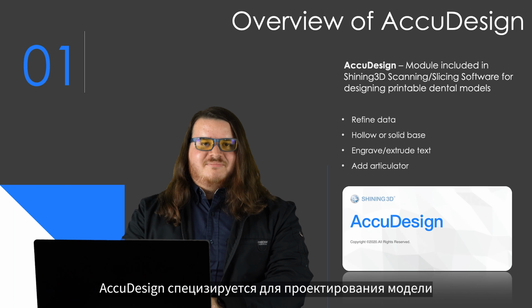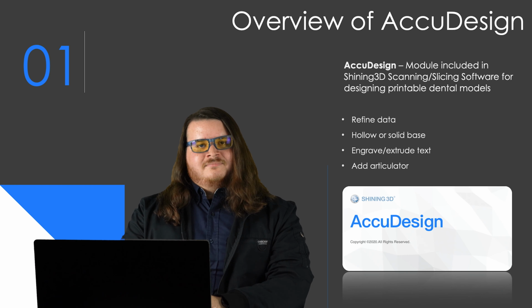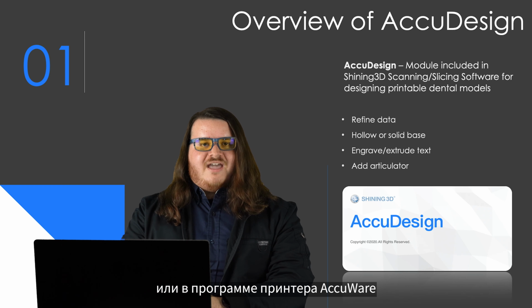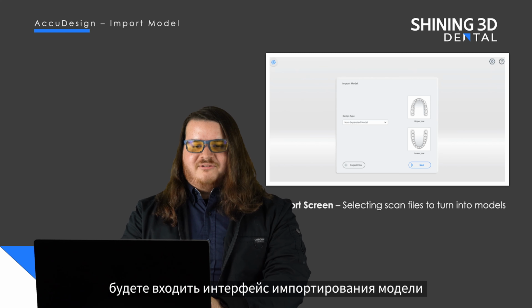AccuDesign is our model building module included with our scanning and slicing software. It can be accessed from the pre-design phase of the scanning software or at any point during use of AccuWare. Once you open AccuDesign, you'll be greeted with the Import Model screen.